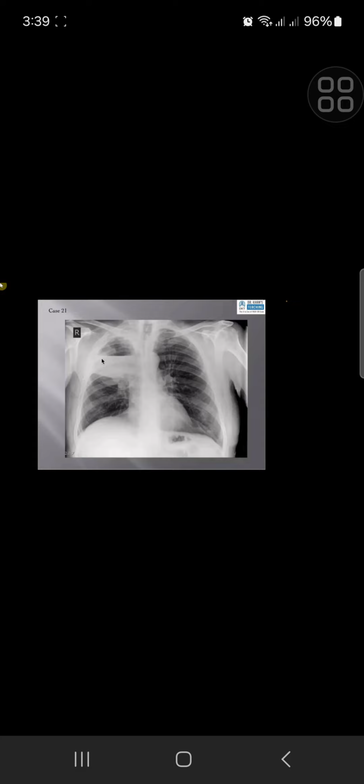Okay, all right. Pneumothorax is air in the pleural space. Pleural effusion is just fluid in the pleural space, and a hydropneumothorax is air and fluid level. You don't get air in the pleura. A pleura is just two membranes which have very little fluid normally. When there is fluid which is manifestable, that's called pleural effusion, and you don't get air unless pneumothorax. But if you get air and fluid, that's called hydropneumothorax.